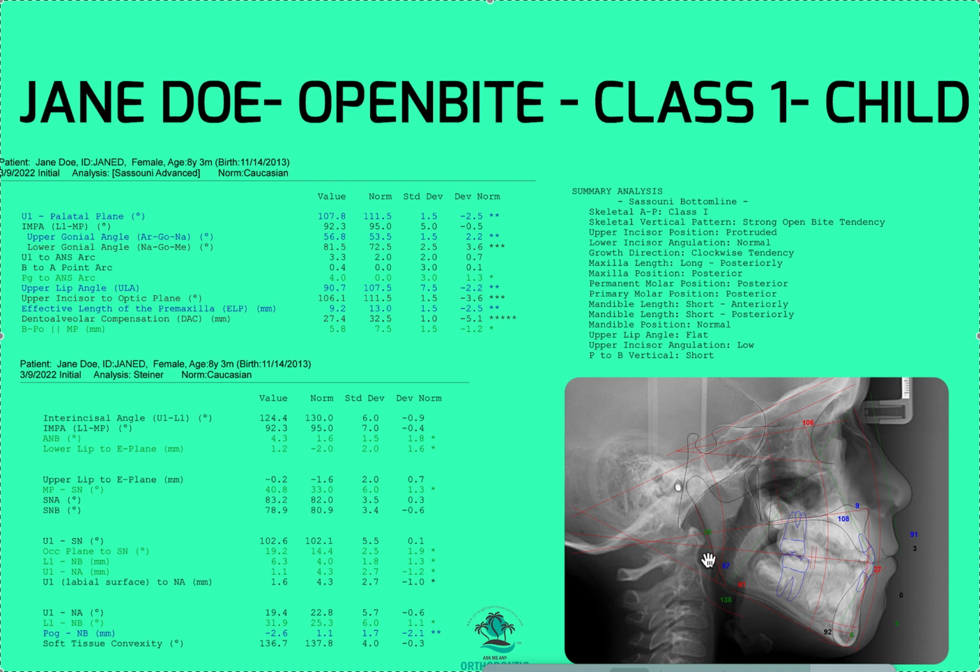I'm looking at the shape and the angle of the mandible, the position of the jaws relative to the cranial base. I'm looking at the nasopharyngeal airway. I'm looking at the oral airway. Woo, that looks super small right here. So that's a red flag to me. I definitely see that the face is growing really long and there's a gonial notch here, which is a red flag. I see some chin strain in the soft tissue here. This is really long. The face is supposed to be in thirds. This is really long down here relative to this. So that's a red flag to me.